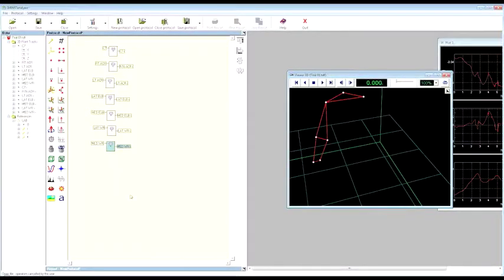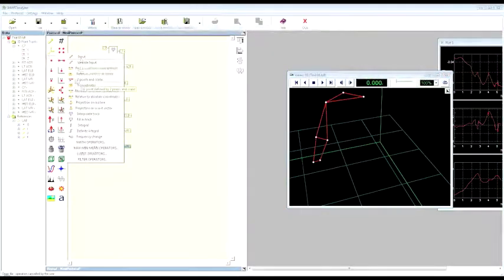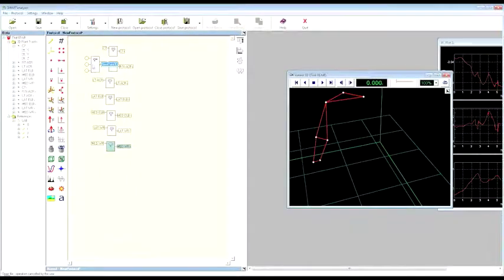In order to compute these two virtual points, as the output in this case is going to be again a 3D point, we can select the 3D point operator, and within the available list we can choose this option, that is the 2 points and scalar.